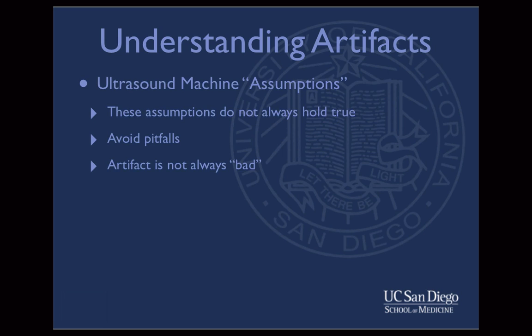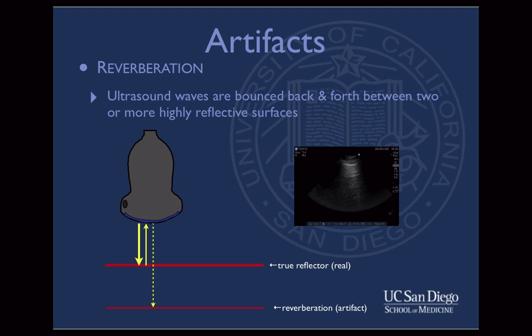It is common knowledge that these assumptions do not always hold true. However, keeping these in mind while scanning will help a sonographer avoid pitfalls and identify artifacts. It should be noted that not all artifacts are considered bad and can be helpful in certain situations. We will now discuss some of the more commonly encountered artifacts.